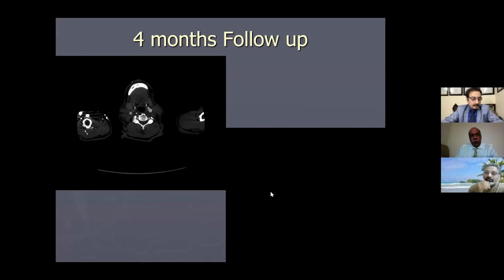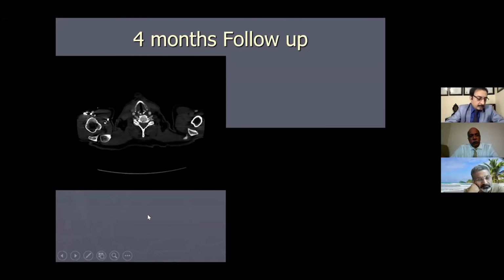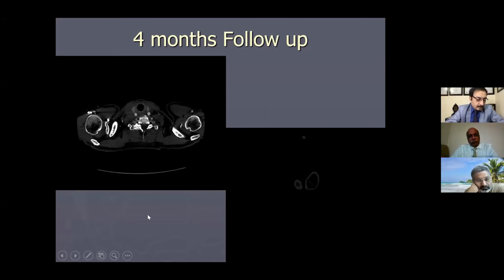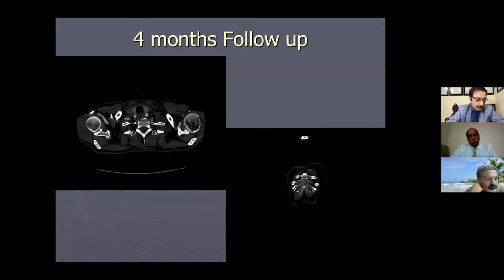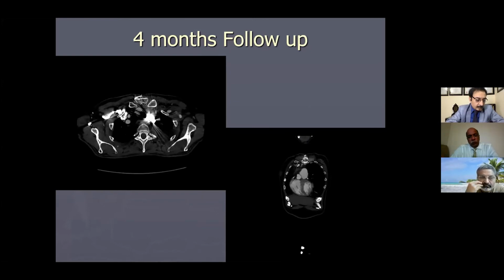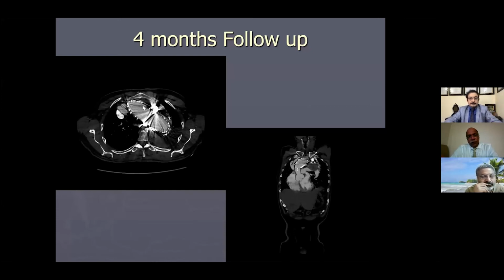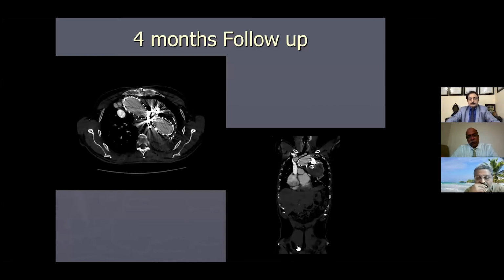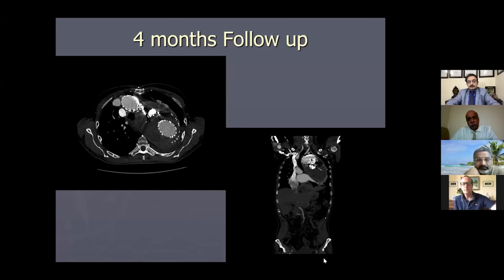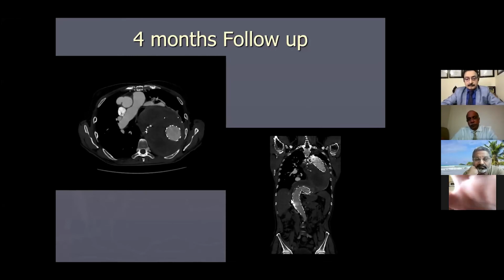This is a 4-month follow-up of the same patient. And again, you can see that there is no endoleak here, and no endoleak below.